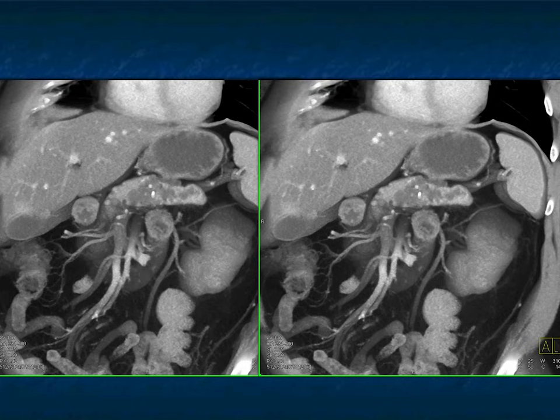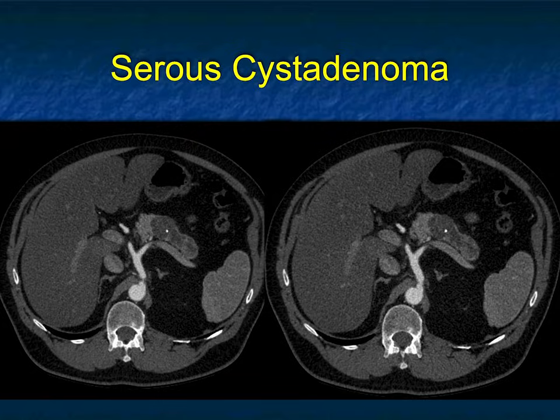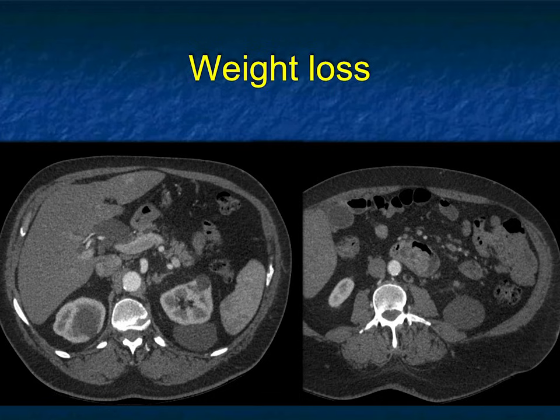And again, a bunch more images. What do you think? Serous cystadenoma. People often say serous cystadenomas don't have duct dilatation. That's not the case, and this was a good example. Again, calcifications were helpful.